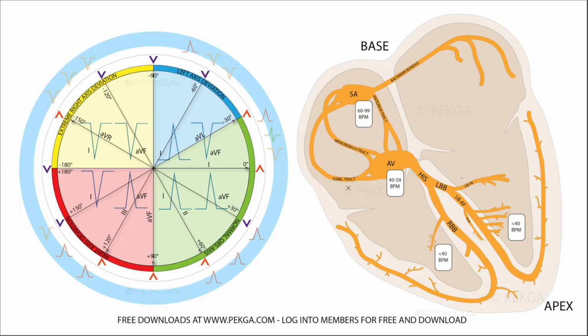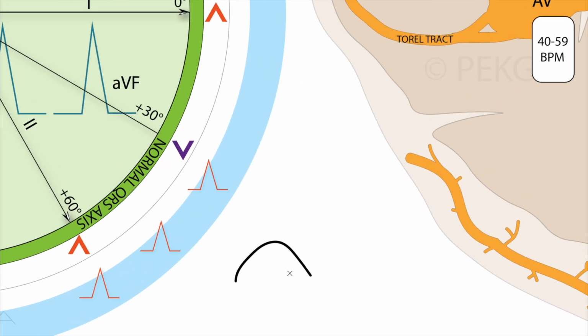And let me talk about left atrial enlargement. So as your signal leaves the SA node, it's traveling down to the AV node. Both of the atria are getting depolarized. What happens is, on your ECGs, you get a nice little P wave. That really is a combination of your right atrium and your left atrium depolarizing at almost the same time.